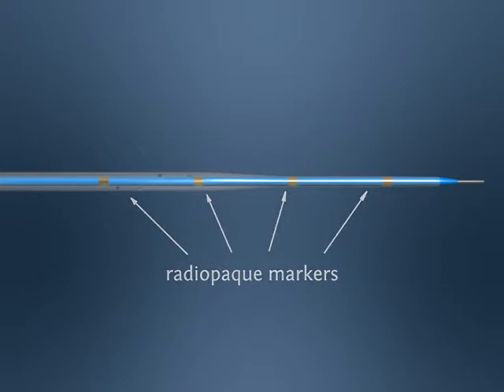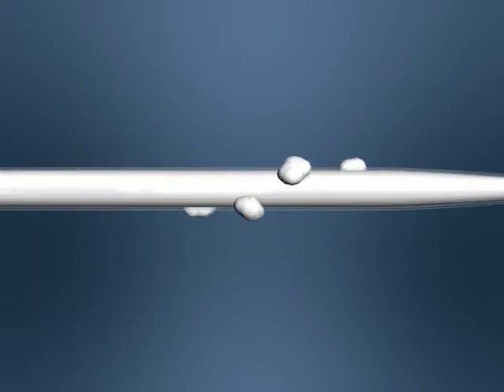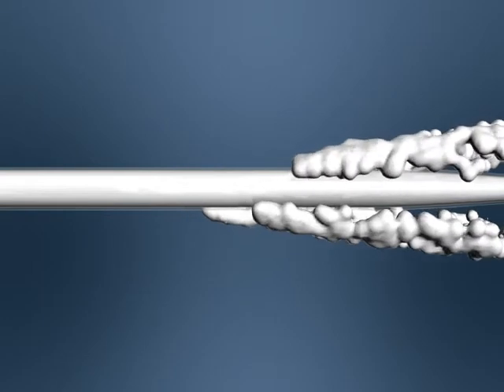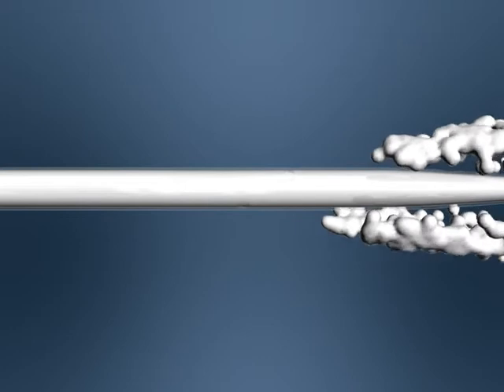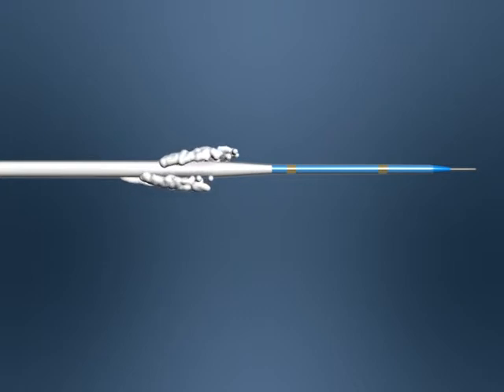There are high flow holes between the 3rd and 4th radiopaque markers, enabling local injection of drugs or iodinated contrast in order to observe the condition of the distal vessel. Proximal contrast media can also be injected simultaneously by means of a guiding catheter, distally to the lesion, enabling the lesion's characteristics to be observed.